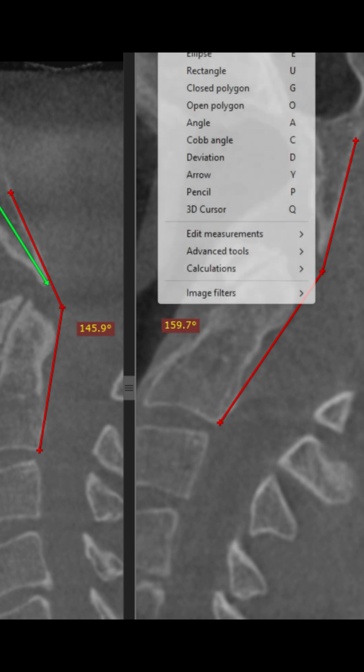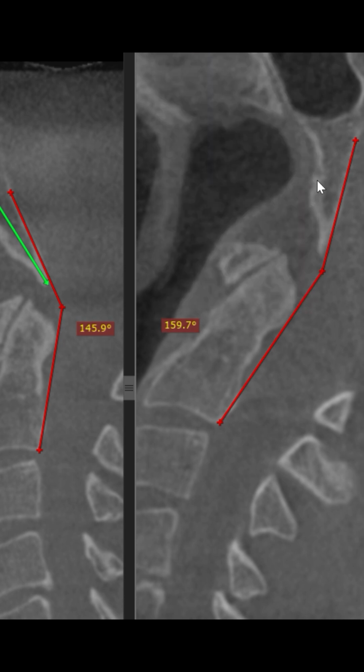And let's just take a quick look at the arrow. You see how much closer it is to this line. This is going to be a very important thing to keep an eye on while you're doing the CXA, because you'll have to be doing the other measurements. And you can also see the fact that the ADI closed up on the top, that V sign closed up, so there might be some transverse ligament issues going on, but that will be viewed in another episode.